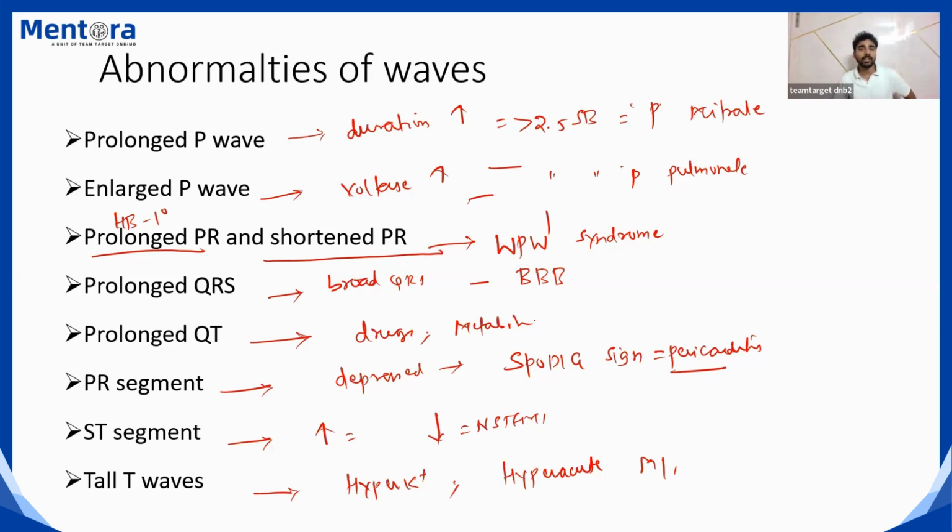And last is tall T waves. Tall T waves you can see in case of hyperkalemia or in case of hyperacute MI. So this completes our basic thing.